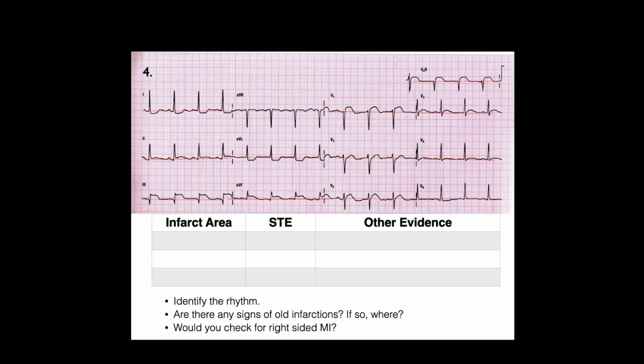There is ST elevation in V4R. And elevation in V1, which is an identifier for a right-sided MI as well. And then slight V2 depression, which is also identifiable for our RVMI. Which, I'm sorry, what was that one? V2? V2. Yeah, good. Okay, yeah, excellent. Yes, please, Cody.